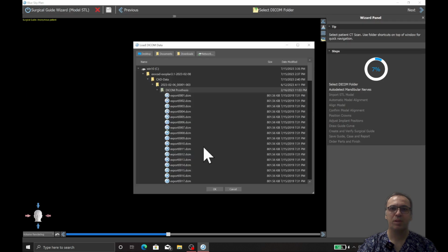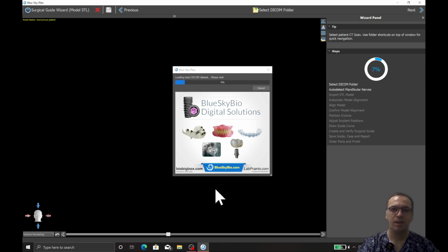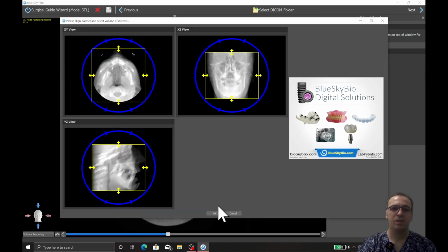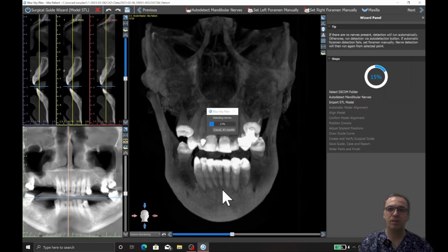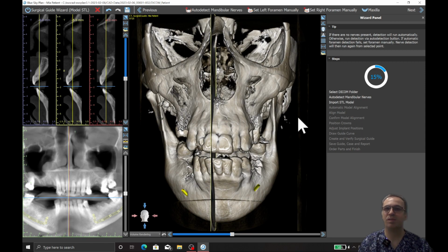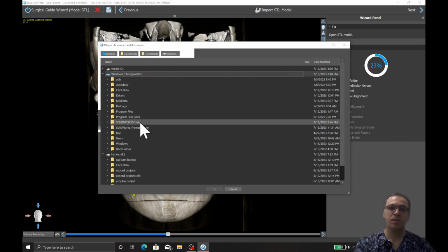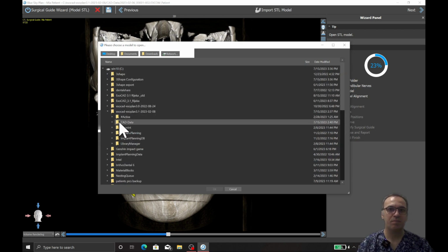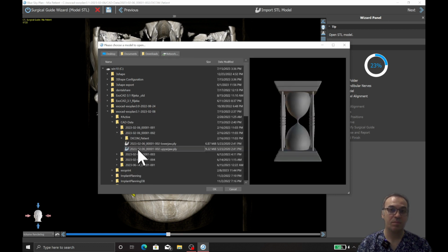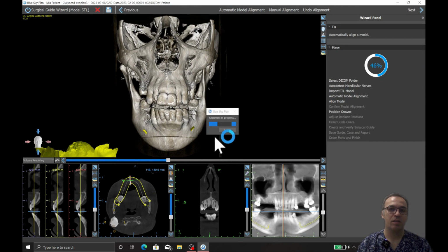Hello everyone, today we are going to show you how to make an easy one-implant surgical guide. And I know that this program, BlueSkyBio 4.11, is one of the most simple ones, and you can use it effortlessly. For this video I'm going to use the wizard, so you have step-by-step progress and easy design of the surgical guide. So we have a surgical guide in a few minutes.